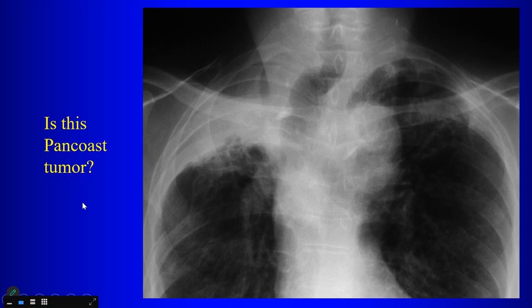Okay, so if this is not Pancoast tumor, what is this then? Fibrosis. From? Radiation. Radiation bilateral? And so certainly, radiation is not a bad choice.